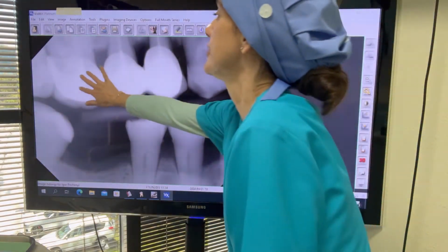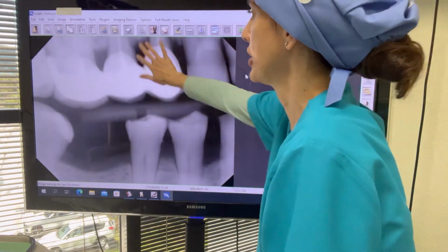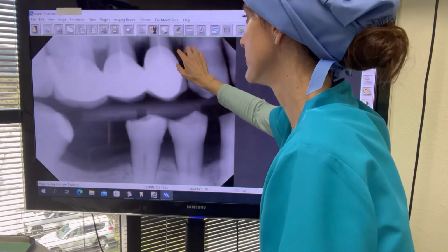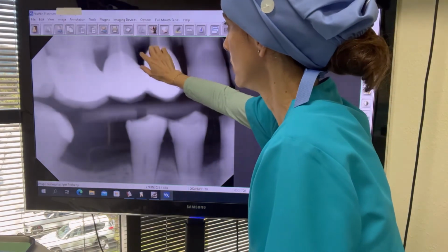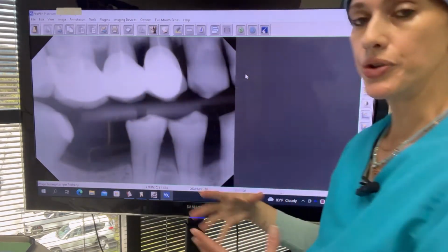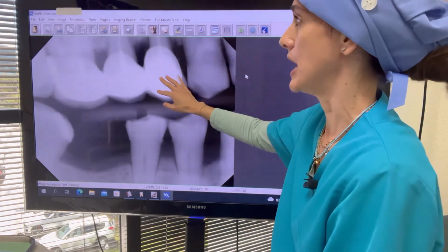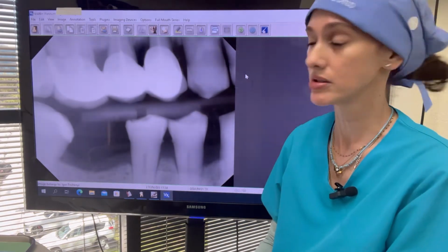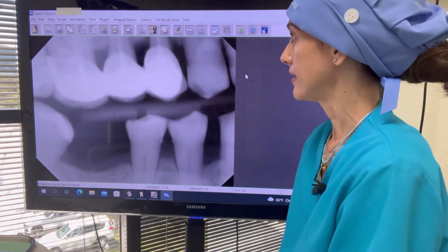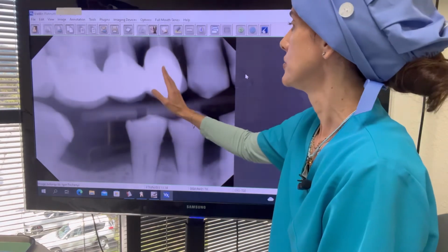And remember, these are the three crowns that were joined together, and I can work and save these two ones. Again, we have to work on the gums, on the bone, but we can save them, replace them with new ones. These are porcelain metal crowns. I don't work with metal crowns. I only work with all ceramic crowns, and I think they're more compatible, they're better. So that's what we're going to do.